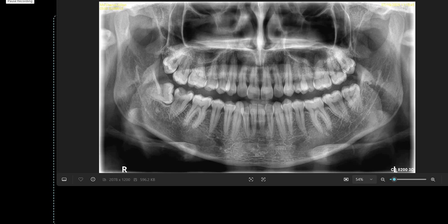This is an absolutely fantastic episode about how we are going to correlate 2D X-rays and how our AI software analyzes those 2D X-rays, and then we're going to compare those results with the gold standard three-dimensional CBCT. The OPG will be analyzed by the AI, the CBCT will be analyzed by me, and we're going to check and verify if the AI software actually found all the pathologies and if they were accurate enough that the 3D also got it.